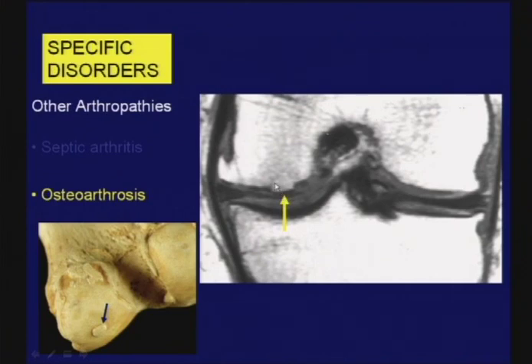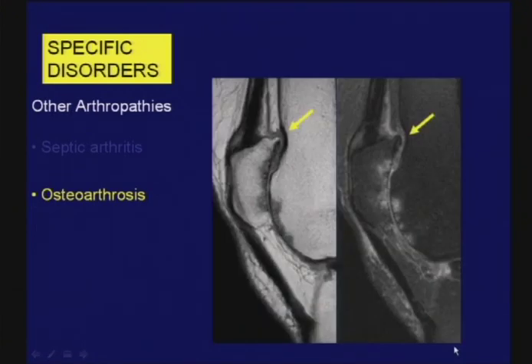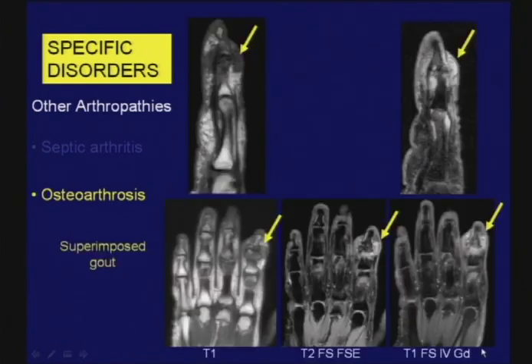And yet you can see that they have marrow continuous with the marrow in the adjacent bone. Widespread patellofemoral disease in the absence of femoral tibial compartment abnormality is suggested to be a finding of calcium pyrophosphate disease. It is not specific, but one of the interesting phenomena you see with this can be erosion of the distal anterior surface of the femur.